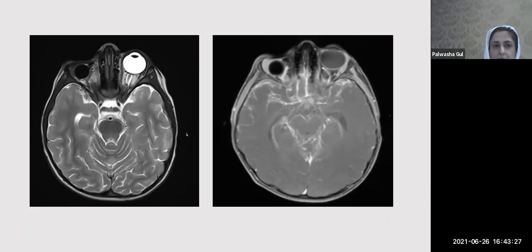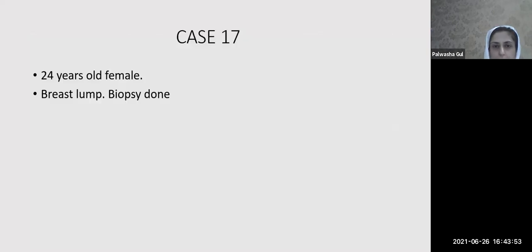So just say there is a prosthesis, then once you're thinking about retino, say that the contralateral globe is fine, but unfortunately the patient had leptomeningeal enhancement and there was leptomeningeal spread of retino. So even if history is withheld, this is a typical exam case and you are supposed to pick it up, say the buzzwords, say trilateral, quadrilateral, comment on the contralateral globe, and then you can go ahead.